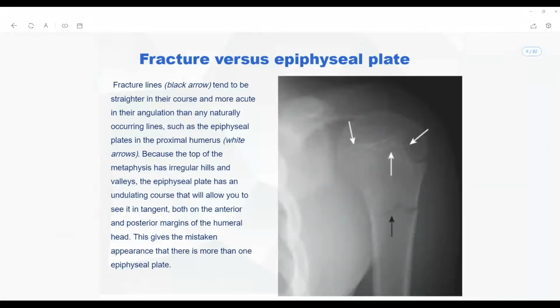Okay, medial to lateral. See, this is a complete fracture. The reason is that you are ignoring the cortex orientation on the medial side. Look closely here. There is a discontinuation of the cortex along this place as a thin edge. Can you recognize it? Can everybody see it clearly?